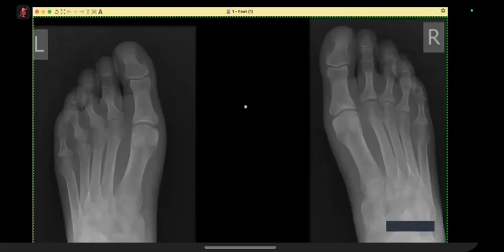Okay. I'm presented with an X-ray of both feet, of a female complaining of chronic foot pain, and I see that there is a bilateral metatarsophalangeal joint pathological process in the form of periarticular erosion and cortical irregularity, with no intra-articular affection.